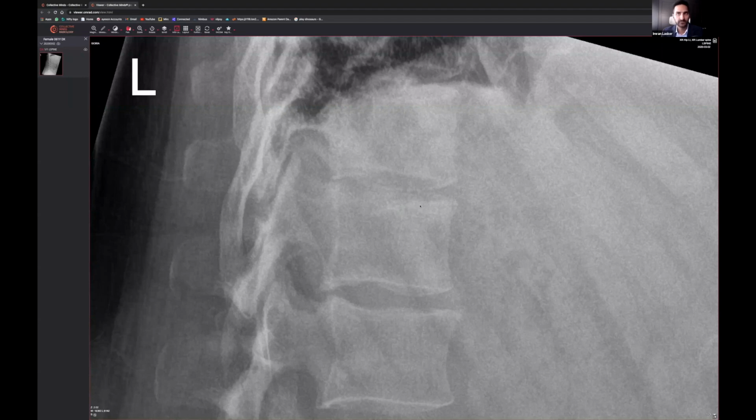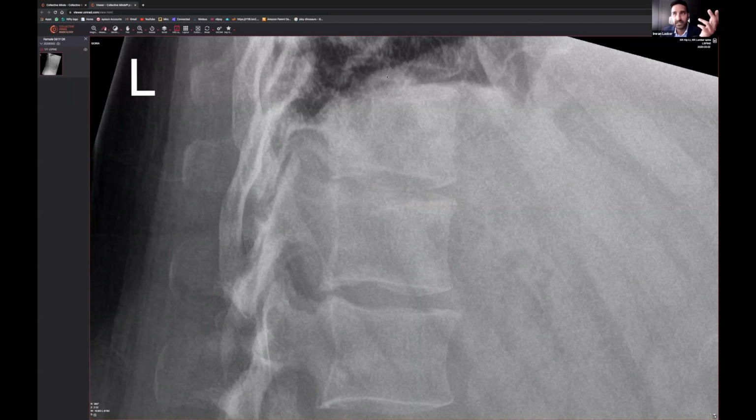This one doesn't look well-defined, and if I get that pen function out, like so, you can start to feel as though this doesn't look quite right. This doesn't look normal at all. And this patient actually did end up going further and finding out that they did have a fracture in this particular area over here, which was kind of seen on the X-ray anyway.